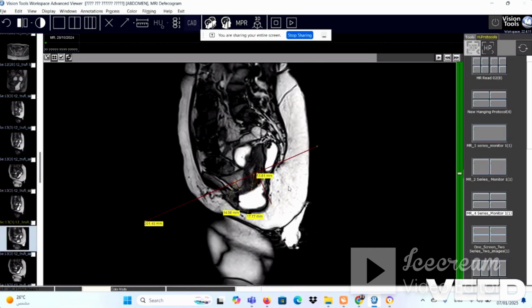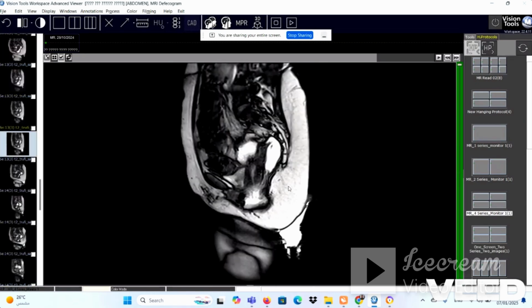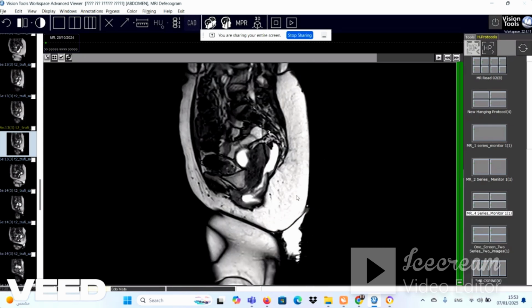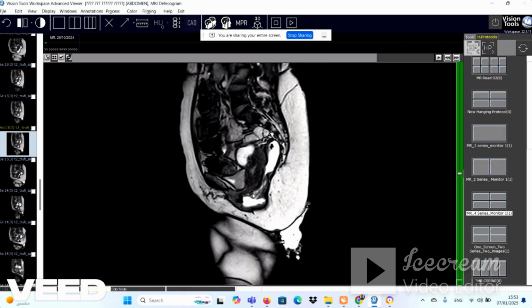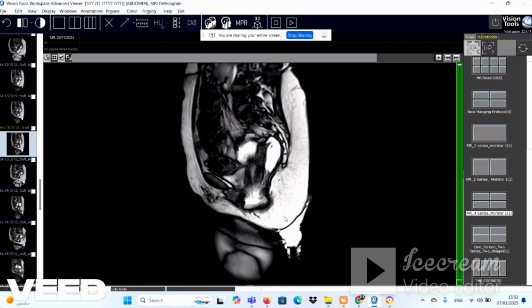We need to add something here, and it's one of the most important tips. Look for the uterus. In the dynamic image, the uterine cervix is compressing the rectum and the rectal wall. Look here, the gel is markedly attenuated in this segment. So we have a functional obstruction added to the prolapse of the posterior compartment. This is very important as well to comment on in your report.